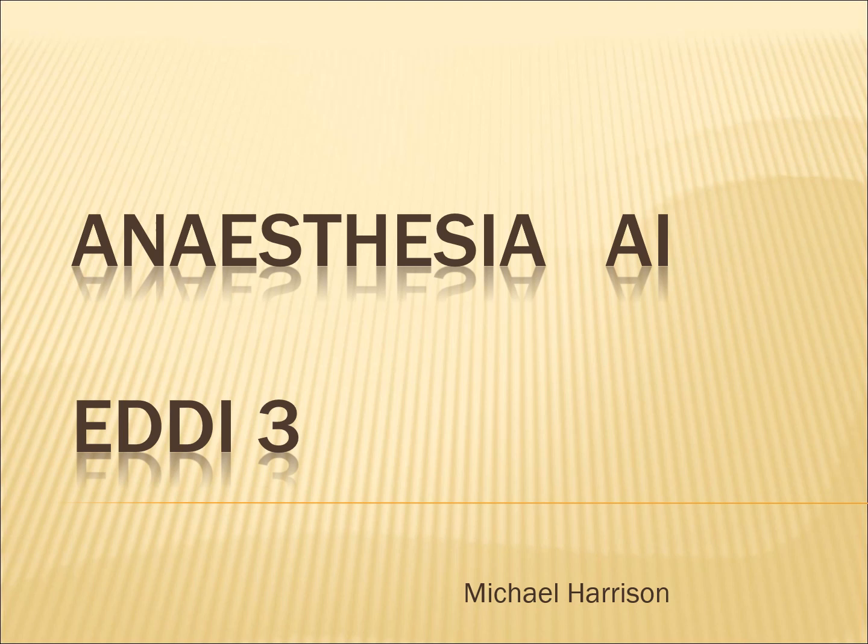Eddi is software that can detect early signs in physiological data that allow it to suggest diagnoses of adverse events during anesthesia. When making a diagnosis, it is always good to have an abundance of evidence, preferably arising in different ways. The confirmatory evidence for hypovolemia comes in the form of RAPPV, that is, respiratory associated pulse pressure variation, commonly abbreviated to PPV.